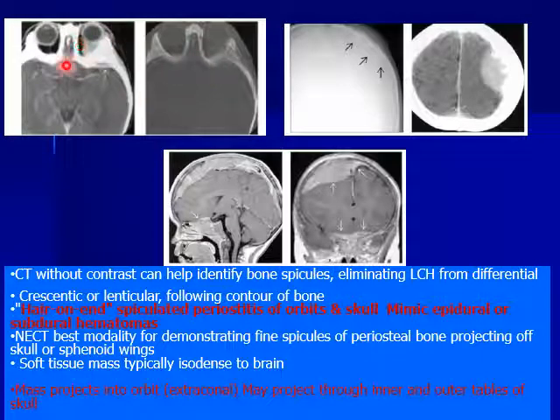These tumors like the areas of the sutures. Look, this is along the sagittal suture, and this along the coronal suture, and it likes also the skull base, the mandibles, and the sinuses. Very characteristic appearance of this metastasis. If you see it, you will not mistake it.